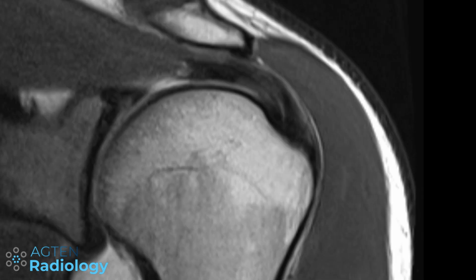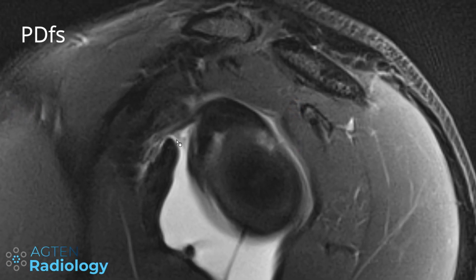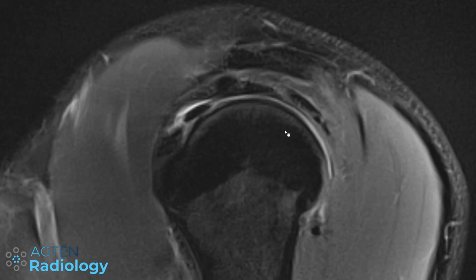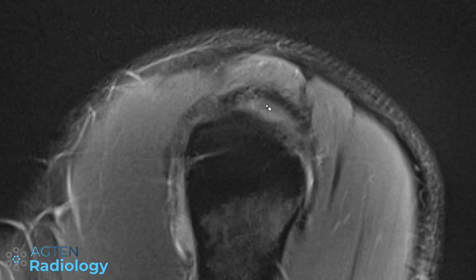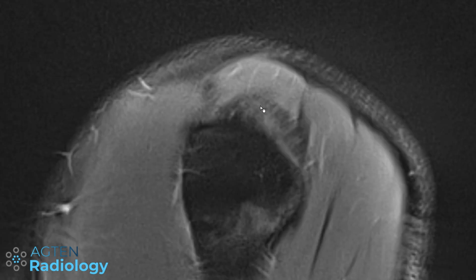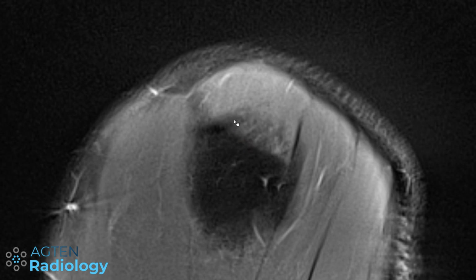We can also see this on a sagittal proton density weighted sequence. This is anteriorly, subscapularis, supraspinatus, infraspinatus, and we scroll anteriorly. We can see here this is the infraspinatus tendon blade and this is the supraspinatus tendon blade. And they already have some overlap here. And it's not well depicted here, we might see better examples, but you can see here all this orientation of these fibers. I'm not sure if you can really see it on the video, but they are oriented slightly posteriorly.